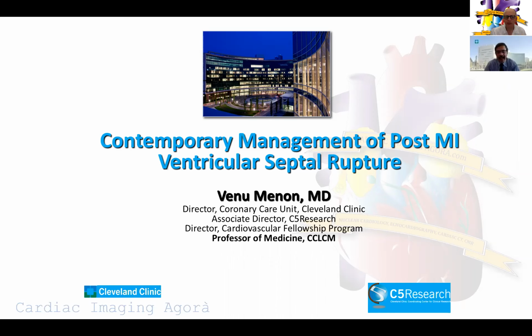All right. So what I thought I'd do was talk a little bit about imaging of ventricular septal rupture. And the reason I did this was I know in your group of talks, you've talked a lot about CT and MRI and the newer modern modalities, but bedside echo is still a really important critical tool in the management of acute patients who are really ill. So let me just run you through an example.